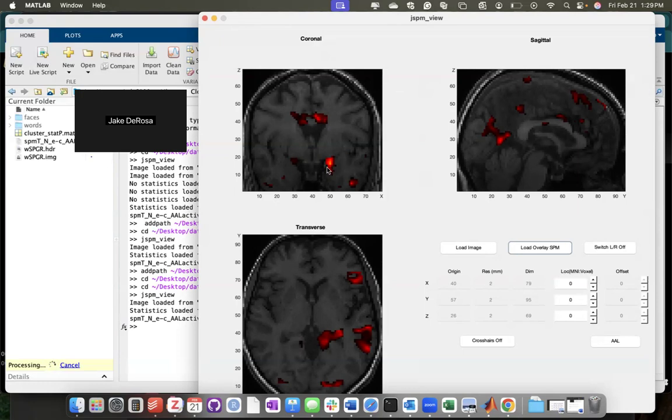What you're looking at here is significant activation in the brain corresponding to the specific word conditions that we're viewing. I'd be happy to explain more of how we measure significant activation in the voxels responding to different conditions, but we'll focus on just what you'll be doing in MATLAB for now. Once you're done with this, you're going to be loading various statistics that you'll note from the lab document, answering those, and for each significant activation for our different conditions, reporting the test statistics, and that'll be pretty much it.